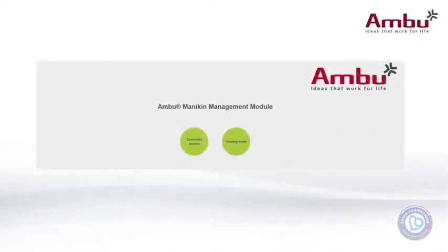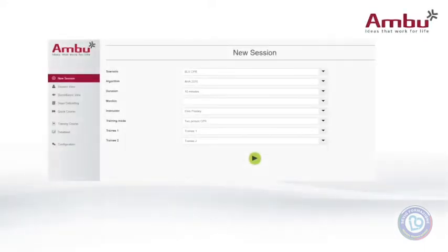Ambu Man Advanced has different access, viewing, and control modes for training with instructors and students. The controlled session allows the instructors to have complete control of the training. It is also the area where the administration of the database and stored scenarios are accessed. In a controlled session, instructors can fully customize their training sessions on the Ambu Man Advanced.